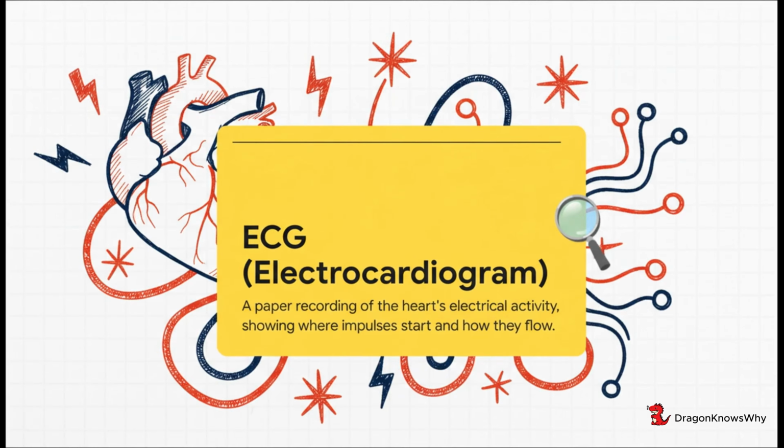So, what exactly is an ECG? Well, to put it simply, it's just a paper recording of your heart's electrical activity. Now, it's not measuring how hard the heart is pumping, the muscle power. Instead, it's mapping out the electrical impulses that tell it to pump in the first place. Think of it like getting a peek at the heart's own internal wiring diagram.